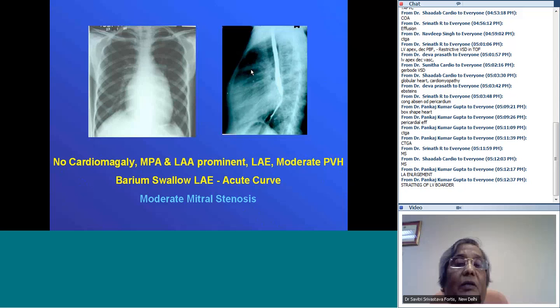And if you see a good atrial appendage, that is okay for mitral stenosis. But if you have a mitral stenosis patient and you don't see a left atrial appendage, then you must think that either there is a clot sitting there or the patient had undergone a previous surgery, so the LA appendage is not there. Otherwise, in rheumatic mitral valve disease, the LA appendage is always enlarged.